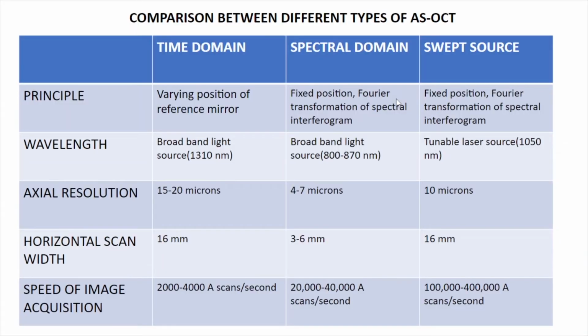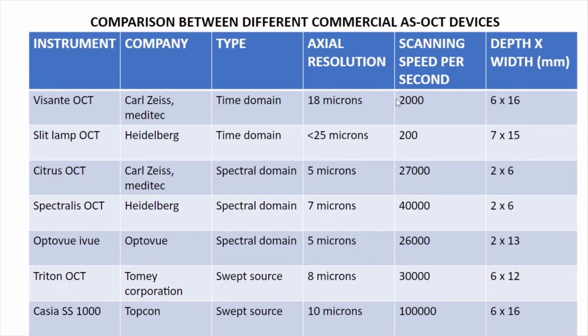Even the angle you may not see very well because of the crowded nature and also the attenuation due to the presence of limbal area there, sclera and other interfaces. So that's why we use UBM, which is ultrasound, which can penetrate through the layers. You can see the lens iris diaphragm better. So if you want to image the ciliary process and the lens zonules, you should prefer UBM. So it gives you better information, right?